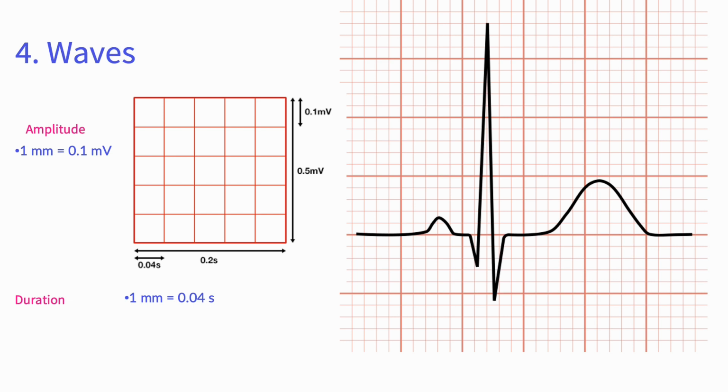The fourth thing you should look at, guys, when reading EKGs are the waves. So we discussed first rhythm, rate, axis, and then waves. It's important to go in sequence so you don't forget anything and miss pathology. Now, this is the EKG tracing. Every wave has a certain amplitude and duration that it should not exceed or be less than.